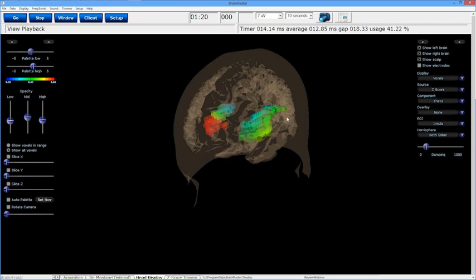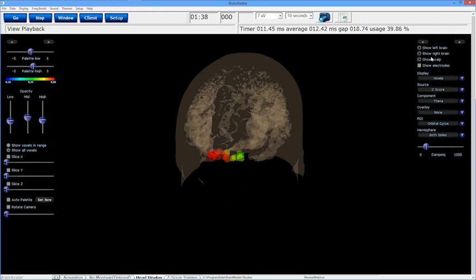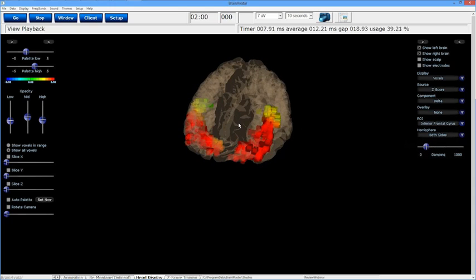and how to best utilize it. I'm just going through and clicking on it as, once again, I'm technical support, but they go into a little bit more on what you're looking at and what you're going to look at. But you're going to be able to just take your time and look at everything that's going on. And of course, you can take out displays. You can change your palette. You can maybe hard set your palette if you really wanted to, and choose the different areas that you want to display.